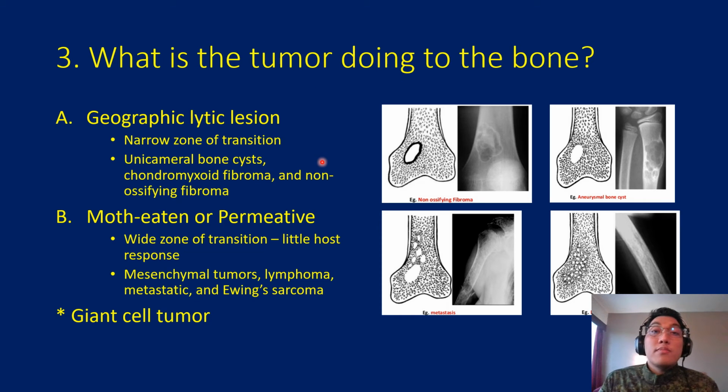For the next question, bone tumors have a limited number of potential effects on the bone, and the most common one is to produce lysis. The pattern of lysis provides major clues as to whether the lesion is latent, active, aggressive, or malignant.